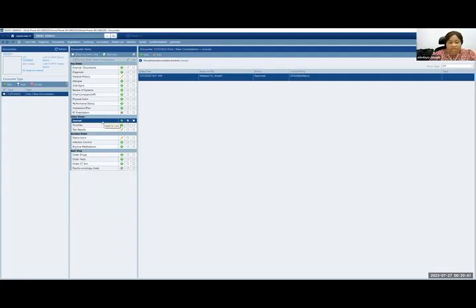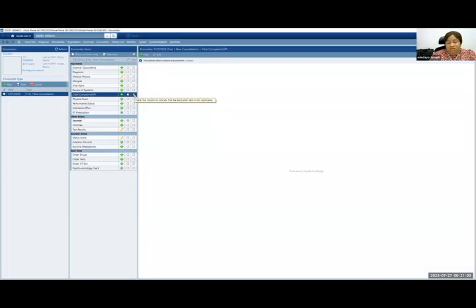Now, how to combat this? So if you're seeing a patient for a follow-up appointment, for example, you may not need to do review of systems again at this appointment, and you certainly won't be doing chief complaints at a follow-up appointment. So what you do in that regard is you select not applicable. So it shows that this column is not applicable on this specific appointment date. But if I'm filling it today, I come and check this to show that it has been completed.